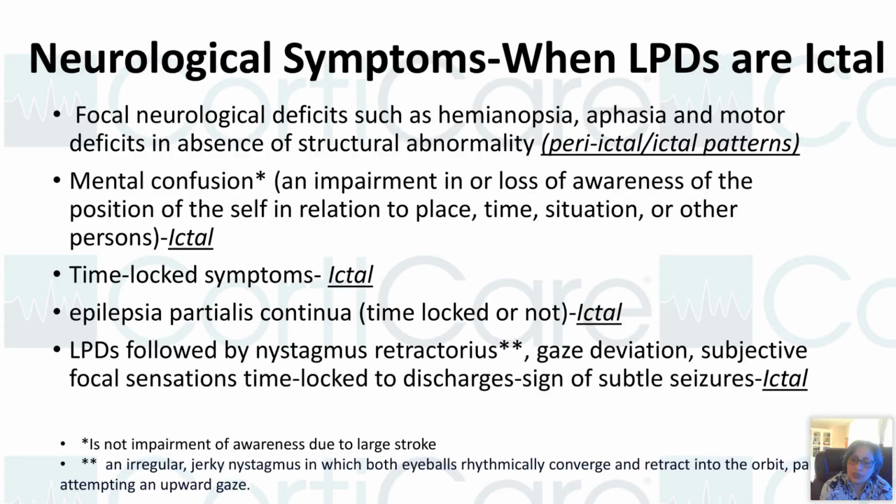So those patterns will be classified, categorized as ictal. Now, irrespective of the frequency, if you see the LPDs are time locked with clinical features, they are ictal, irrespective of their frequency. Epilepsia partialis continua, they're time-locked or not, LPDs are ictal.